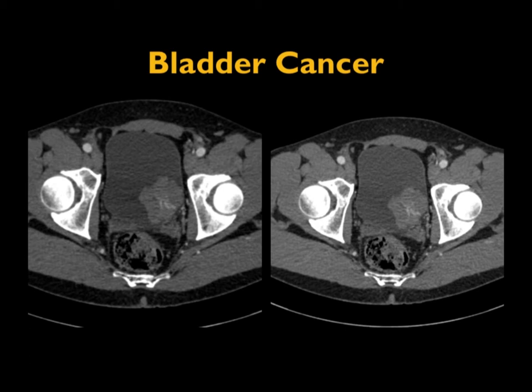They're not hypervascular unless you have a pheochromocytoma, but they are vascular enough to make them stand out against the urine. Now, a second thing is you need good bladder distension. If the bladder is not distended, you tend to overread, cannot rule out tumor, or read every case as an infiltrating tumor. So you need to be very careful.